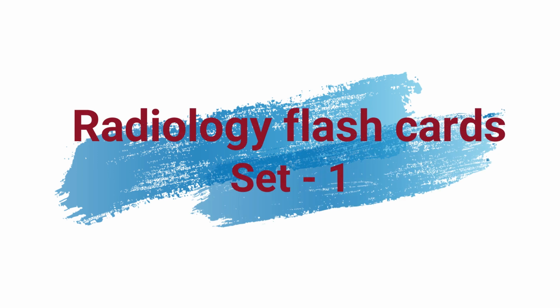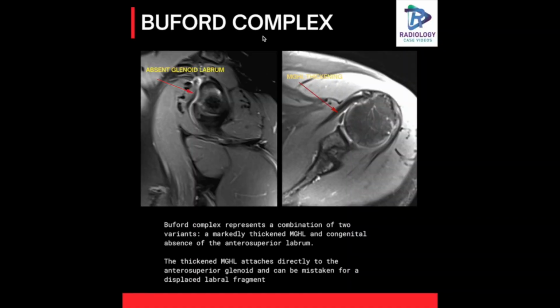Hello everyone, in this video we shall discuss 10 flashcards in radiology. This is the first one, Buford Complex.